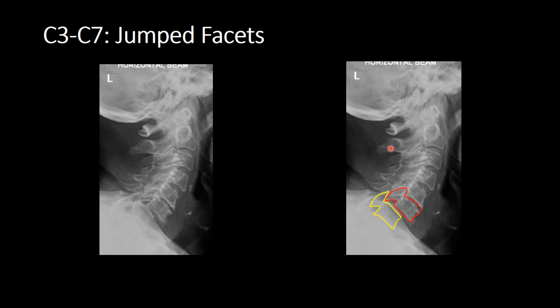Look at our interspinous distance. It doesn't really help with this patient because they've got a grossly degenerative spine, but we can actually see there is a bit of interspinous diastasis. Okay, so we've done alignment. Let's do B for bones. Yep, nothing going on in the skull vault.